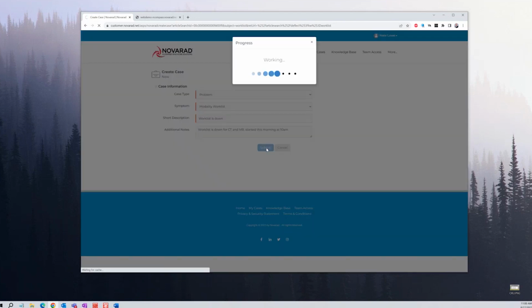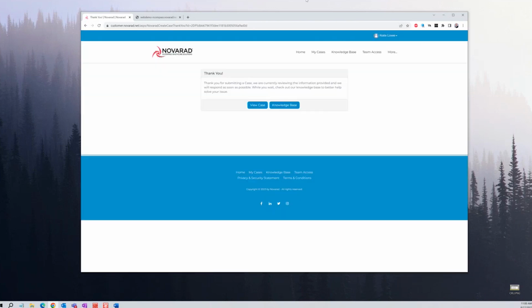I'm going to click submit. A couple things are going to happen. Our support team is going to receive an email saying Nate just submitted a ticket. They'll assign it and start working on it. You will also receive an email saying, thank you. We have received your support ticket. Conrad is now working on your case.